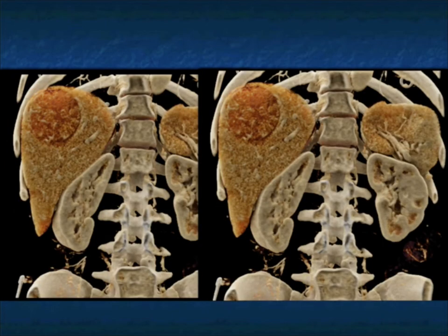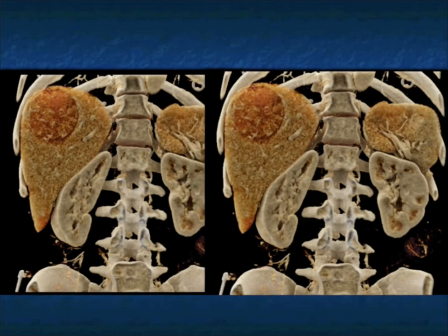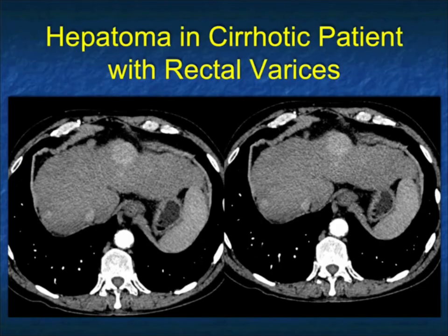Here's the venous phase in that patient on the cinematic. We can see that the tumor literally has that pseudocapsule very nicely shown in that example. So it's a really good case at showing that. Another example right there, another set of images. Now, here's another case, multiple lesions.